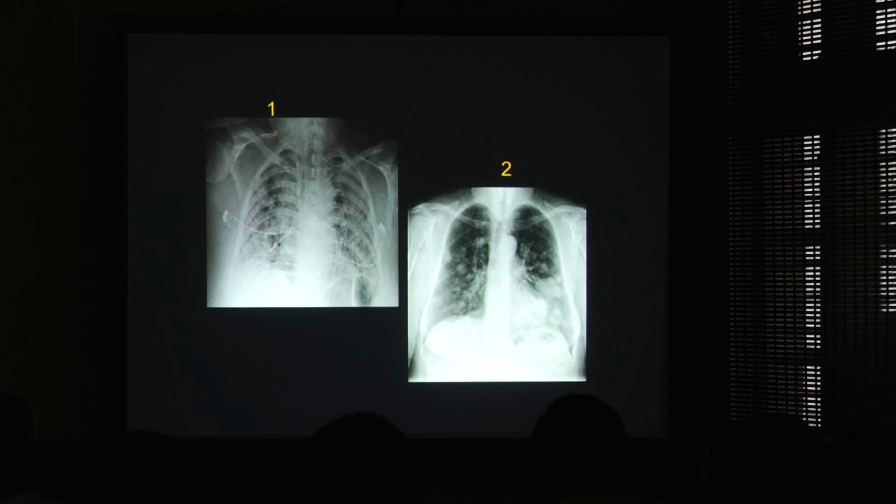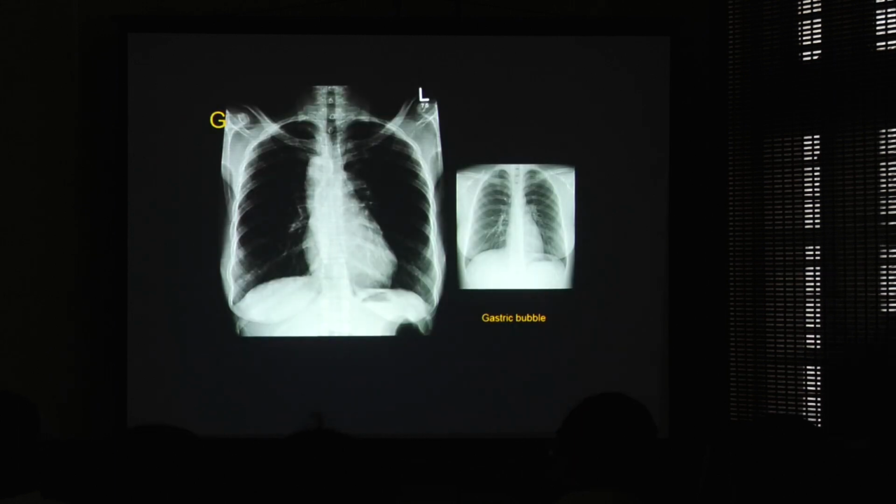So that picture of the second case does not suit a COVID lung appearance, and this appearance is much more suggestive of metastatic lesions in the lung. It is seen more towards the lower lobe and towards the periphery of the lung. That is a typical description. And this patient, after she recovered from COVID, was found to have carcinoma esophagus with multiple lung mets.